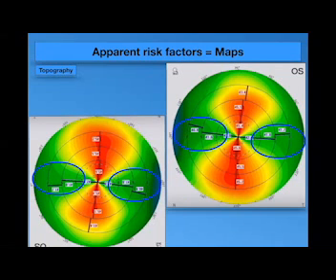So the difference between the superior and the inferior points at the same level, if more than 1.5, you have to suspect. You have to put an X sign on it and suspect this patient's topography.